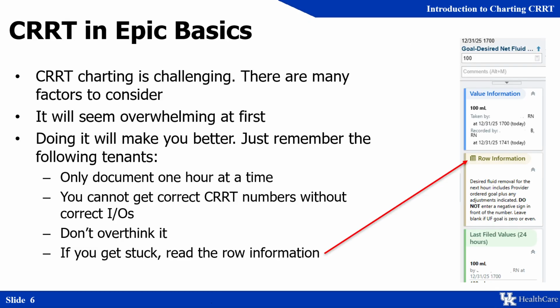I will be the first to admit that charting on CRRT at UK Healthcare can be a little bit challenging. However, most people find that when they practice it a little bit, it starts to get a little bit easier. There are a couple principles, though, that will make your life a lot simpler. First of all, only document one hour at a time. I cannot say this enough. You may hear this multiple times throughout the rest of the presentation.